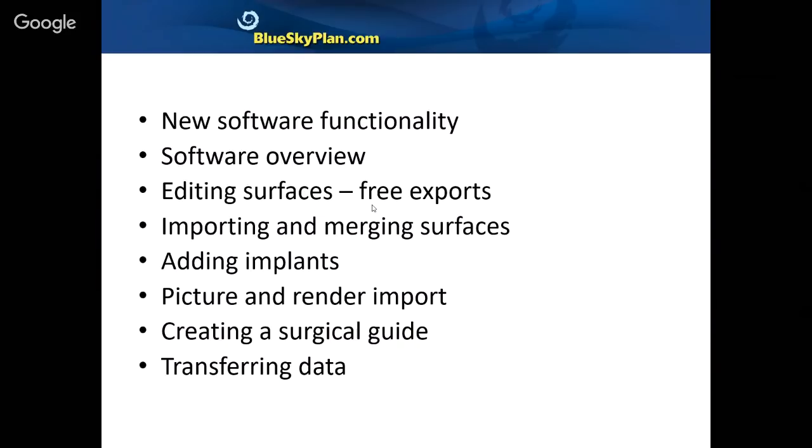We're going to discuss treatment planning and adding implants. We're going to demonstrate and discuss new picture and render import for that OBJ full color STL file. We're going to demonstrate creating a surgical guide and everything connected to transferring data, filling out the approval form and anonymizing the case, creating a report. You could lock the treatment plan, which we'll demonstrate as well, so that nobody can edit it except you without the password. So there's a lot of functionality in the Blue Sky Plan software that we're going to touch upon and demonstrate during today's presentation.